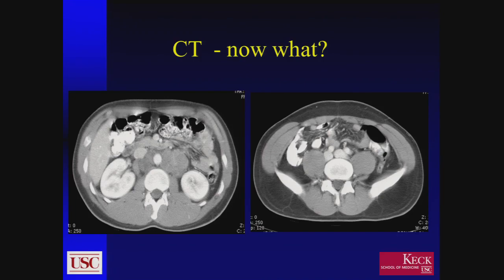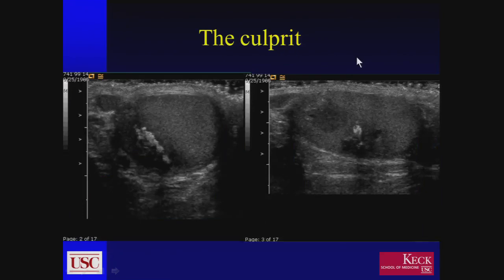But what was interesting was his testicular examination was actually normal. There was no obvious mass, but in fact, one of these things that can happen is you may have what's called these burned out tumors of the testicle, which actually present as widespread metastatic disease, but the testicle itself, by palpation, was perfectly fine. Obviously, you can see this very jagged hypoechoic area with calcifications. He actually has a second mass within the testicle. So again, for these patients who have retroperitoneal adenopathy, even if the testicular physical examination is normal, if it's a young male, you probably want to go on and look at the ultrasound.